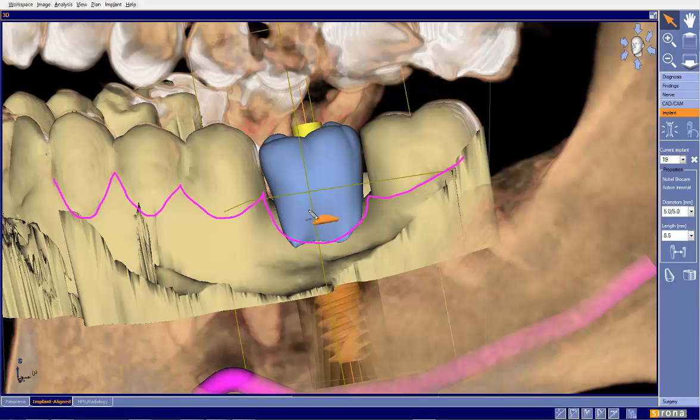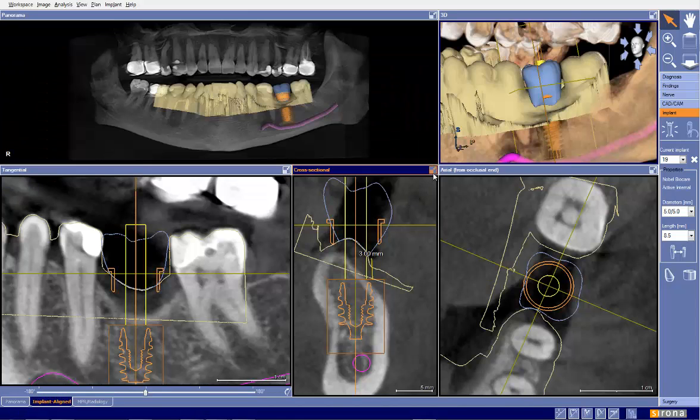As we can tell, we won't have the tooth coming down this low. In fact, I would say our tooth would really only come to about right here. The reason this becomes important is if we draw it so badly, then we design it based on bad data. I'm a big believer in doing it right.